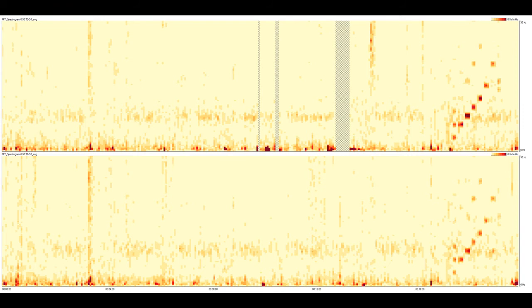Other options are possible. Engineers frequently represent the z-axis of an FFT spectrogram as power in microvolts squared per hertz, rather than as an amplitude parameter. The power spectrogram is created by simply squaring the linear value we've been using in the prior graphs. Using power scaling of an EEG's FFT during trend review is often problematic for two reasons.